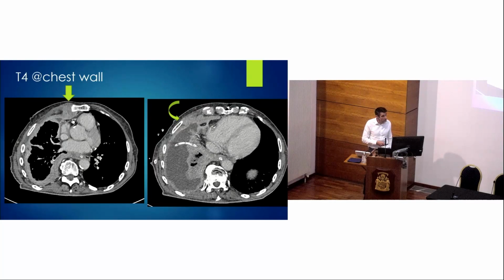And this is T4 of the chest wall, where you're now getting your eye in for this. We've got a rind of abnormal soft tissue all the way around this lung, encasing it. So that's all tumour. It's extending all the way around there. And here we've got tumour extending out beyond the chest wall. Beside this is the sternum or breastbone here. And the same patient at a different site, so multifocal invasion of the chest wall in through beside this rib here. This bright white line here is an indwelling drainage catheter to help rid of that pleural effusion. So that's T4 of the chest wall.